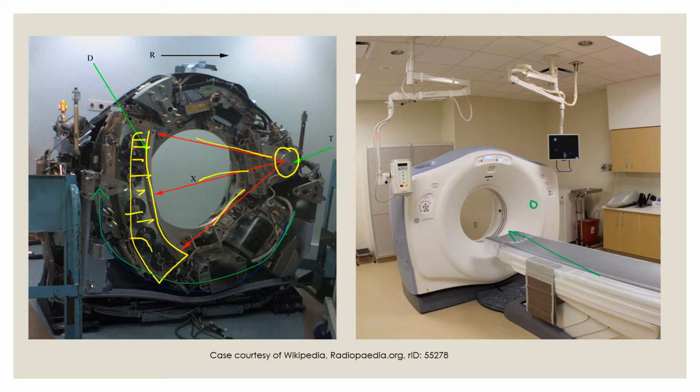So we'll have an X-ray source shining X-rays through an array of detectors on the other side, which just rotates around the patient as the patient moves. Hope that makes sense. It can be very difficult to get your head around this concept, but essentially what this does is it builds up slices of the patient in a 360-degree rotation.